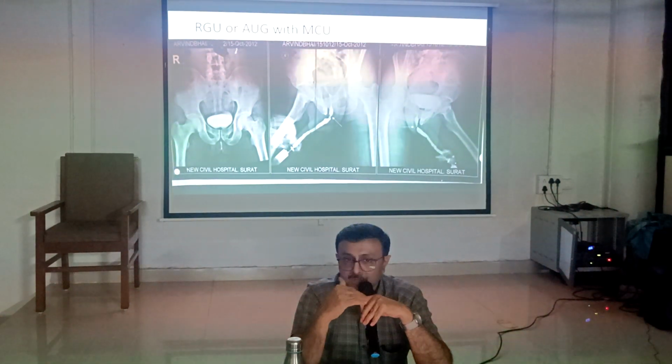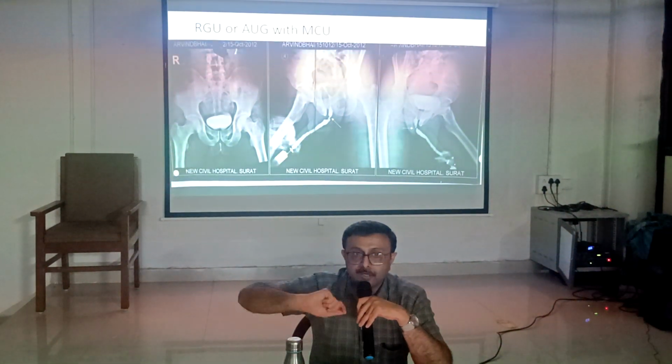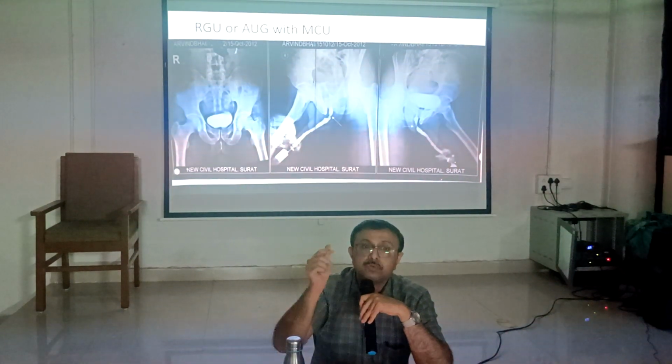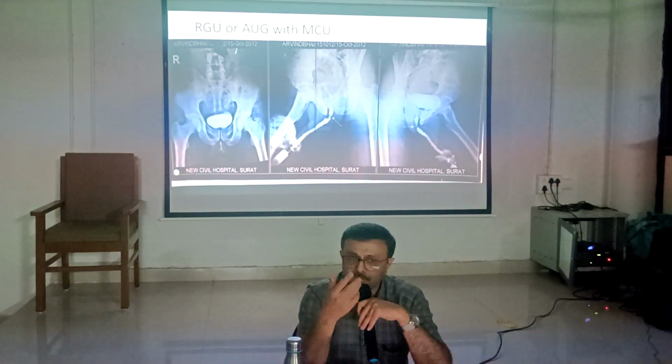Because when there is a complete urethral stricture, the patient presents with retention of urine. So when there is retention of urine, we are not able to perform catheterization. The catheter doesn't go. Then we do SPC. So all patients with complete urethral stricture will have SPC already. So we can do MCU.